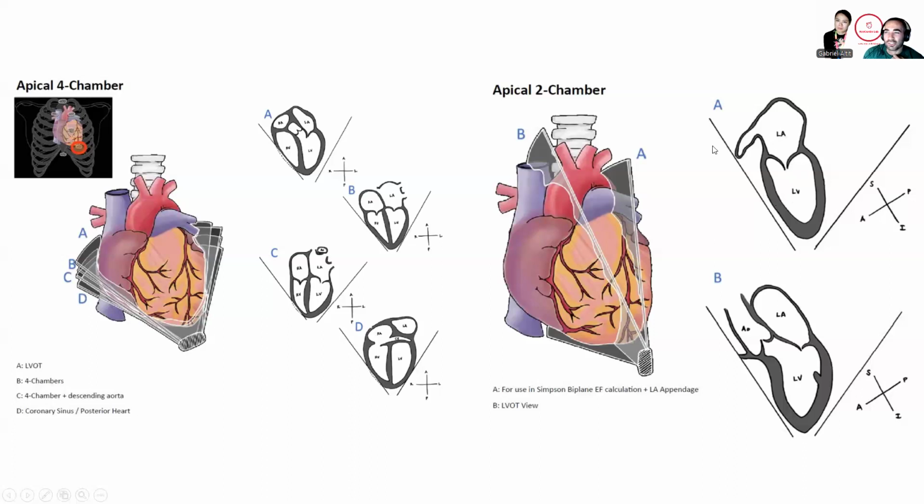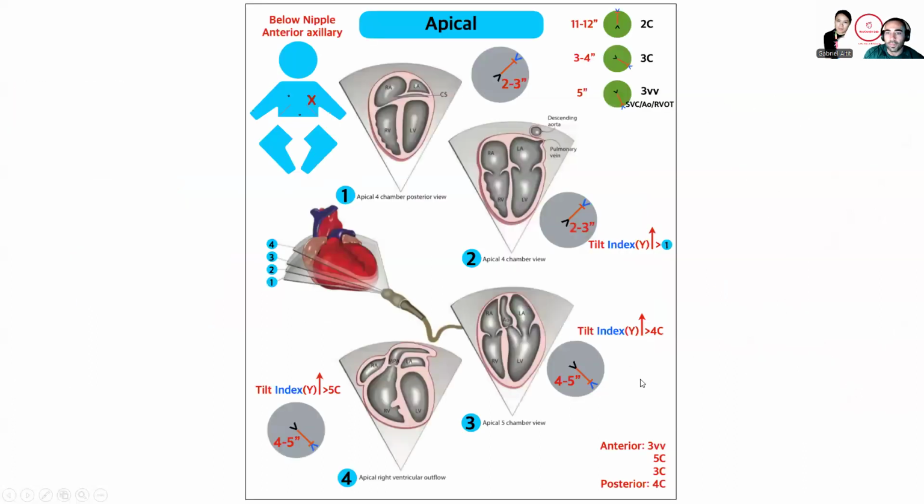In my images, it's actually going to be a bit flipped. Sorry to confuse you. The anterior portion will be here and the posterior portion will be here. So you can see that the cursor could be turned 90 degrees with its marker towards the chin or with its marker towards the back. So either the marker here could be the chin or the marker could be here towards the back. In this particular context, the marker is kind of towards the back. And that's why we have, if we have the probe here, the anterior and posterior portion. So this is just another schematic of that.